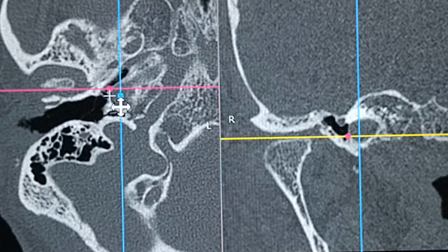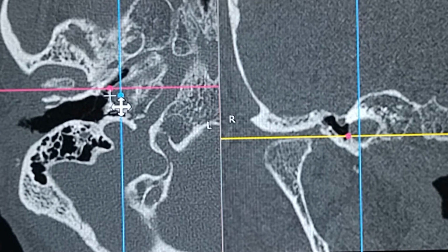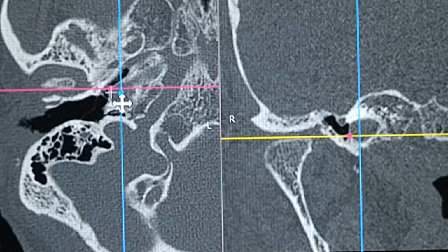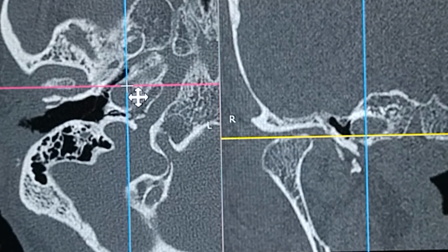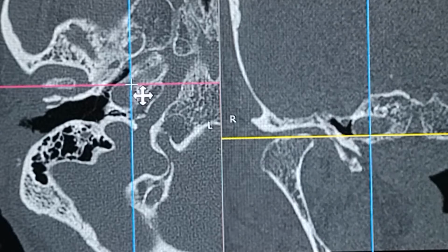So the Eustachian tube opening is kind of superior, then comes the internal carotid artery bulge, and below that will be the IJV, that's the jugular bulb. So this is that bulge which you can see in the middle ear wall. If I'm putting my cursor here, you can see the actual turn. Now focus on the coronal section. You can see the actual turn of the carotid.